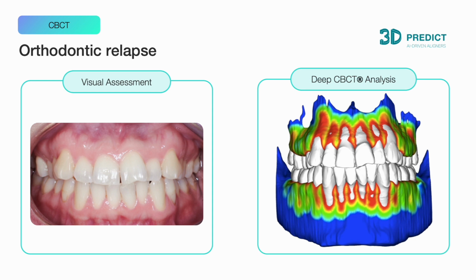The previous orthodontic treatment has caused orthodontic-induced dehiscence, a widespread pattern of bone recession after orthodontic treatment. This was not apparent clinically or on the panoramic. Since this may change the provider's treatment approach, it is best to submit a CBCT whenever the patient indicates they have had prior orthodontic treatment.